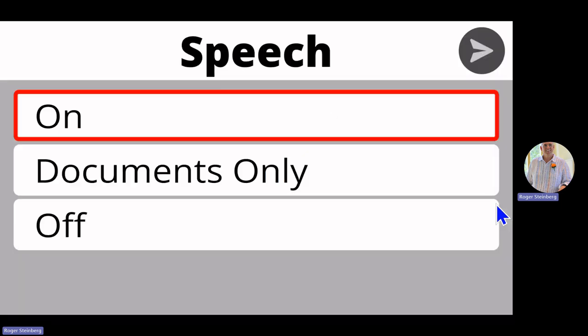Speech menu, 3 items. On. Okay, so you saw that all 4 voices were downloaded and installed. Again, you must select one. You don't have to choose 4, just as many as you think you might use when you're using the software. Next up are to set the speech settings for when I'm using Prodigi.